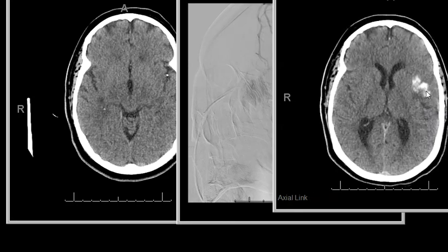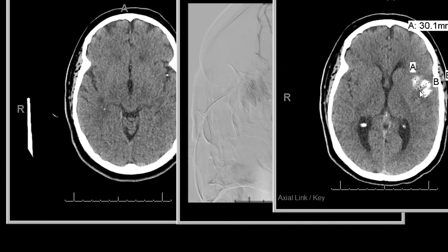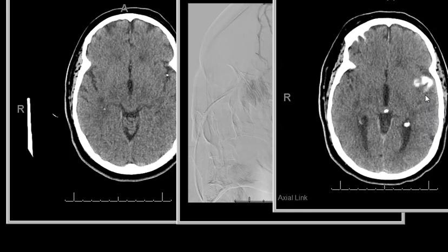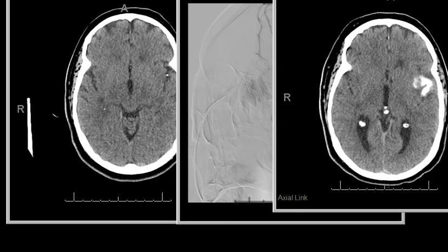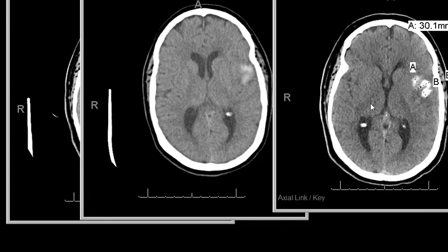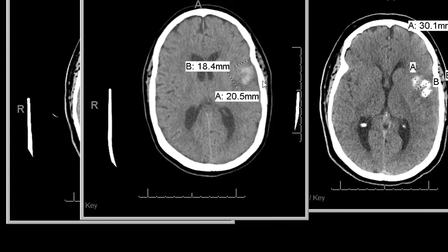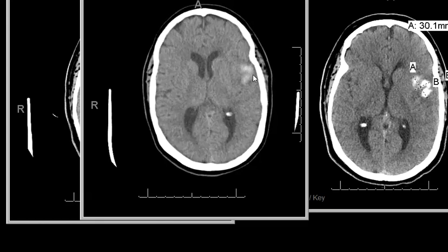some staining. At the time I was in trouble telling whether that was just contrast stain in the area versus hematoma. But actually the next day, it shows a severe decrease in density of this contrast. So a hematoma doesn't go away like that. That's contrast.